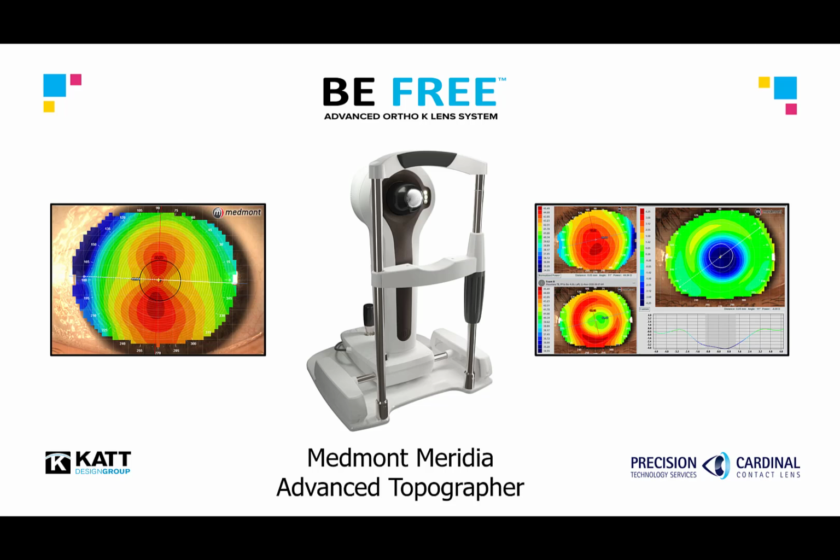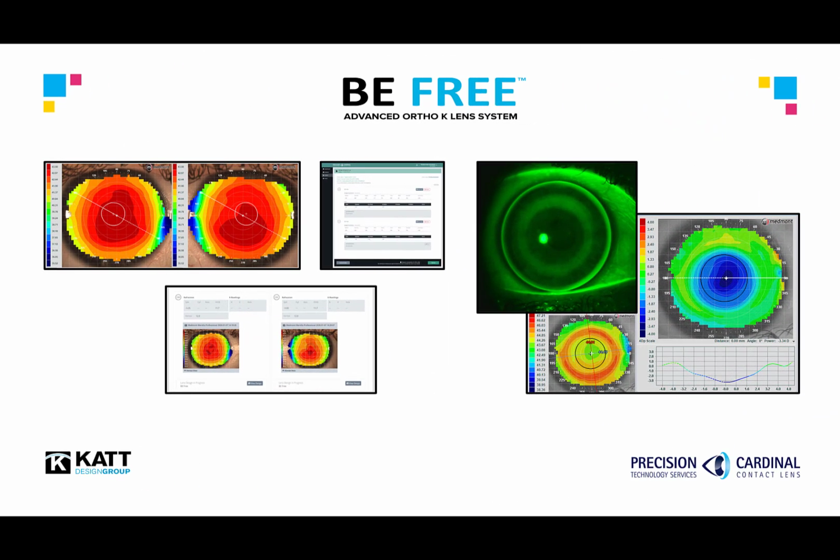This video was designed for users of the BE FREE Advanced Ortho Keratology lens system that employ the Medmont corneal topographer. This video will describe how these two systems work together to create efficiency in orthokeratology practice. The BE FREE software imports in the corneal topography to create a highly customized lens for each and every eye.